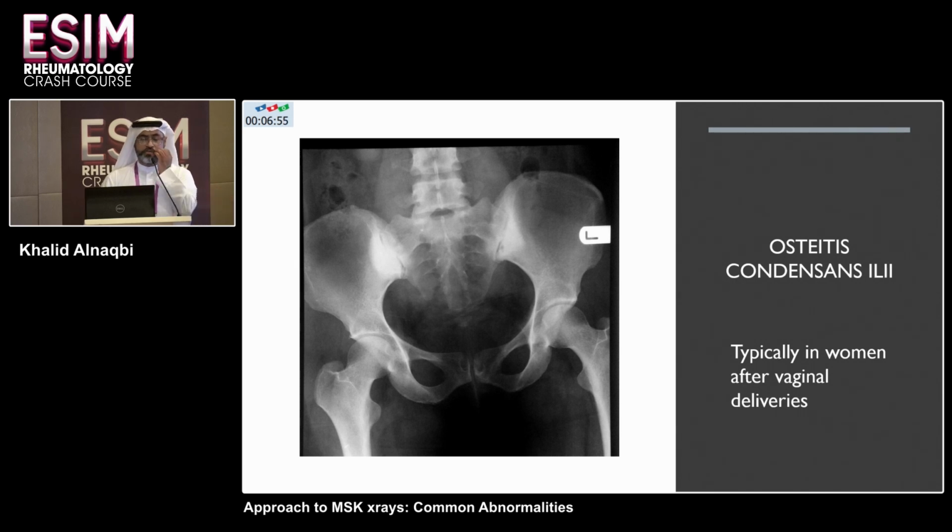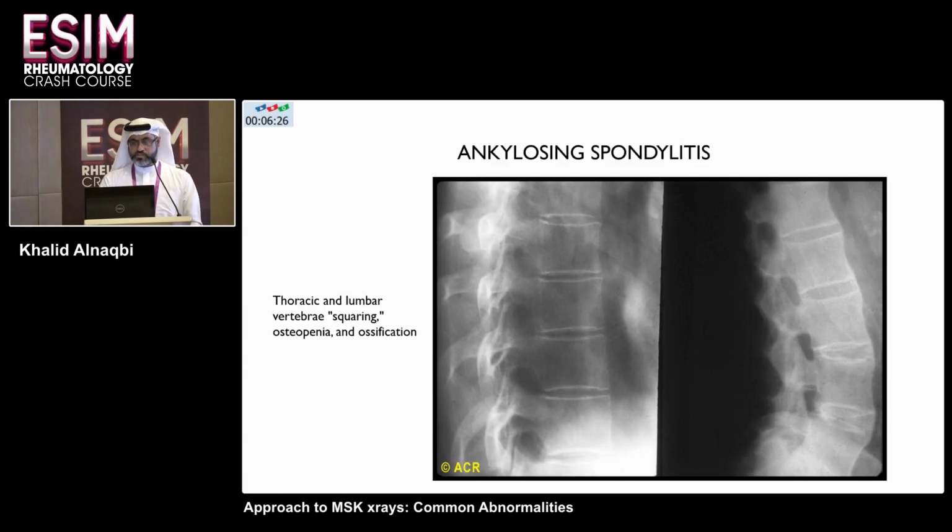This is totally different. I know some women have pain and they tell us so, so we give them NSAIDs and physiotherapy. But there is no randomized controlled trial that was conducted in those kinds of patients. So be very careful in this. And maybe it's good to read your own X-rays as well. It's a triangular area on the iliac side with sclerosis. It's osteitis condensans ilii.